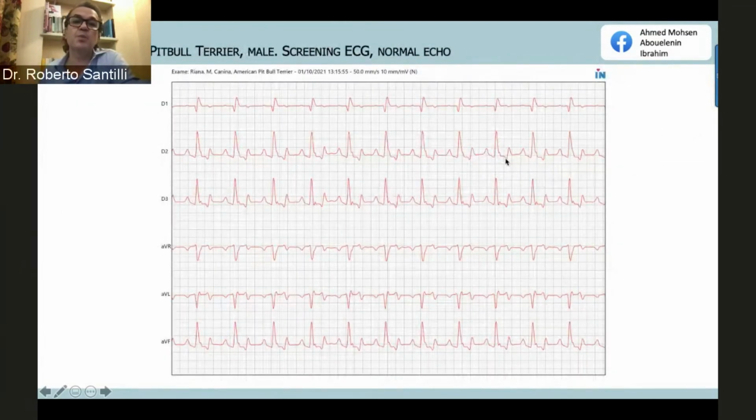So what can it be? There are different options here because there is another thing that you should consider, that this type of T is variable if you compare this with this, with this, with this.